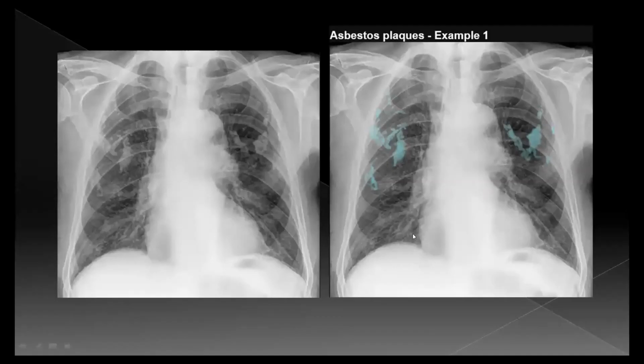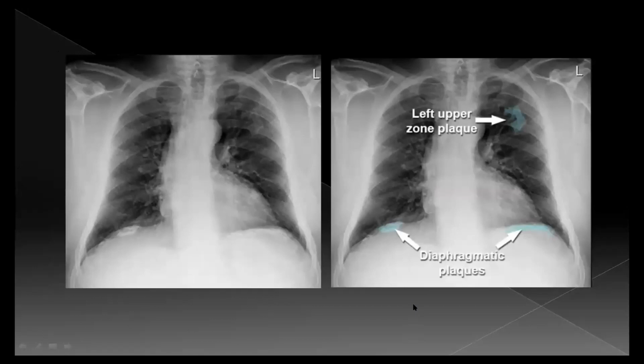Okay. So to close the pleural diseases, we have here pleural plaques. We can identify it bilaterally, and this one is most commonly associated with asbestos exposure or something like this. So again, this one is pleural plaques, calcified pleural plaques over the diaphragmatic copula, and there is a leaf-like shadow. It's not in the lung, but it's in the pleura.